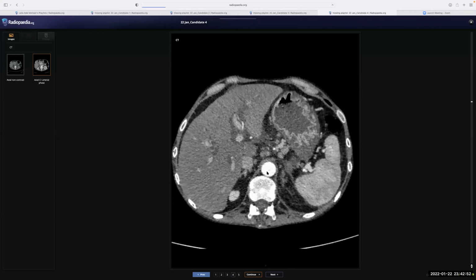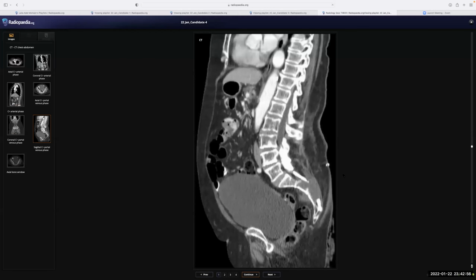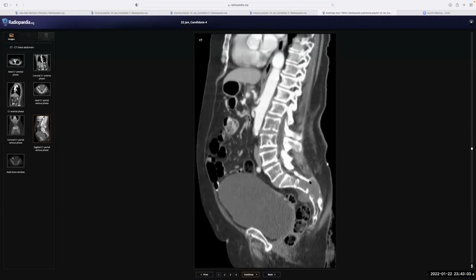So the previous case. So this case, you are right here, that there is a sacral mass in this patient. And you gave a good differential. It is chondrosarcoma, but it's not a chondrosarcoma because of the absence of the matrix calcification. Could be a plasmacytoma and could be a metastasis, could also be a chordoma. And so this patient needs to be referred to the sarcoma MDT and for guided biopsy.